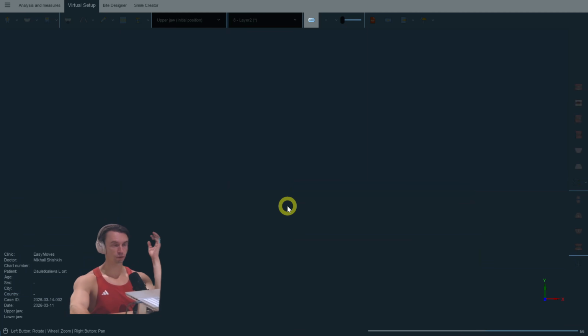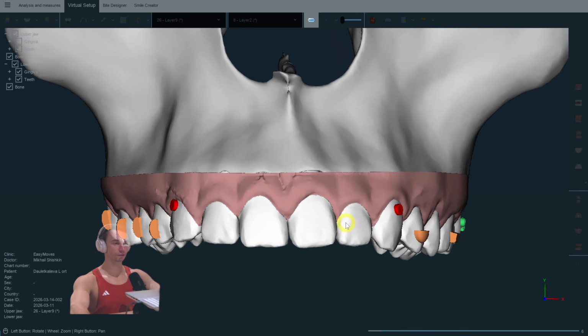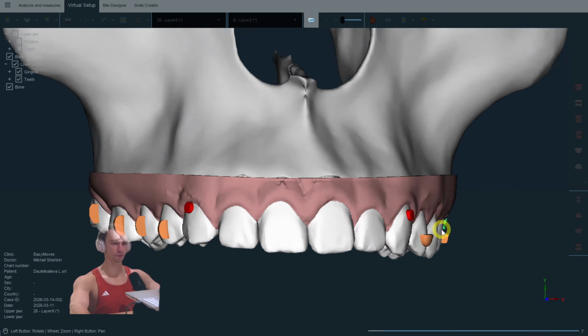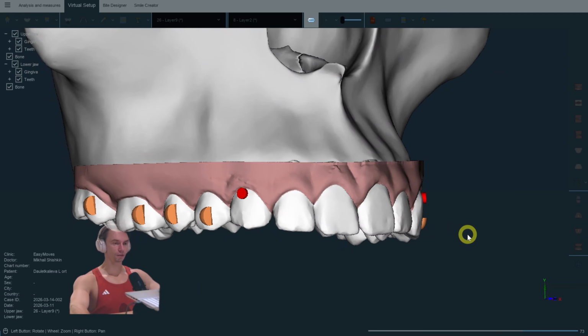Yeah, I have my protocols, and that's why I am estimating it that quickly. If you attend my courses, I'll share my protocols with you as well, with all the attachments and numbers and limitations and stuff. Let's see, it's not that many aligners.